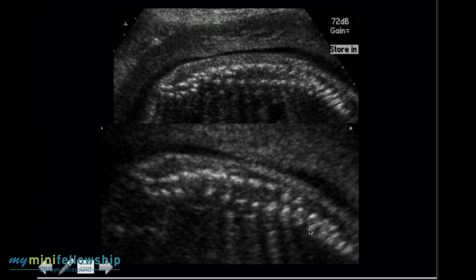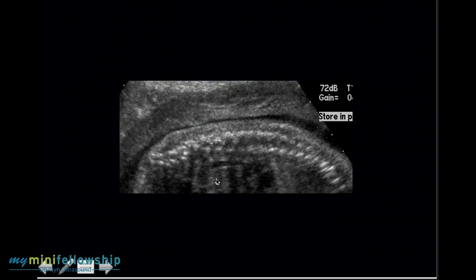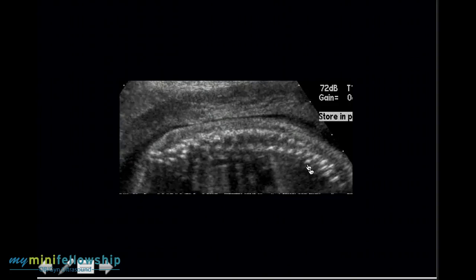And just as these vertebrae are supposed to line up, the vertebral bodies line up posteriorly. To a large extent, these should look similar. So these are the laminae. And you can see that these laminae just don't quite all line up there. This is seen, of course, much more readily in a real-time picture. Okay, so your observation is correct.